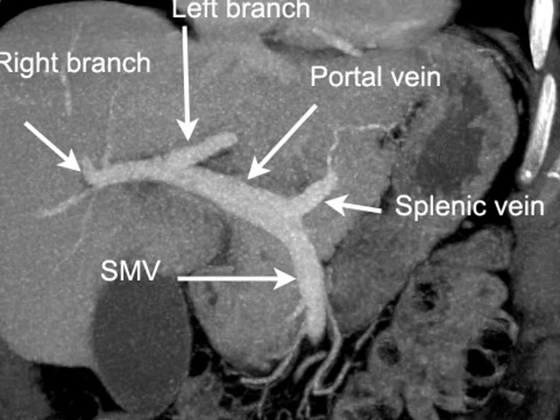MRI? Come on girls. This is a CT scan. Okay? 3D reconstruction, with or without contrast? With contrast, we agree. Arterial or venous phase? Venous.